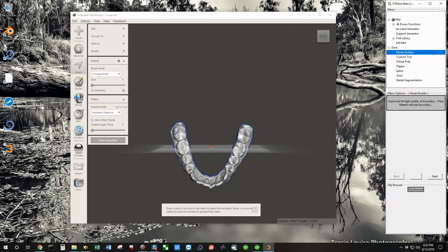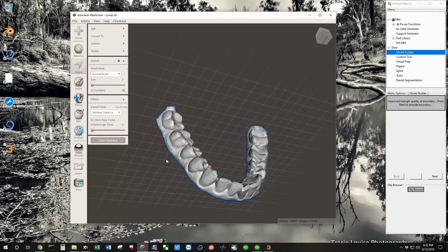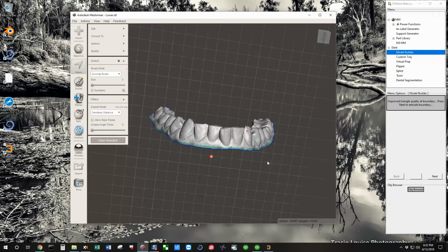It gets next to extrude. I can tell that it's got a bit of teal green. I'm done. This is where I kind of bail on it. It's extended the border. You click on export and then you can save the file. It's pretty much that simple and you're done.